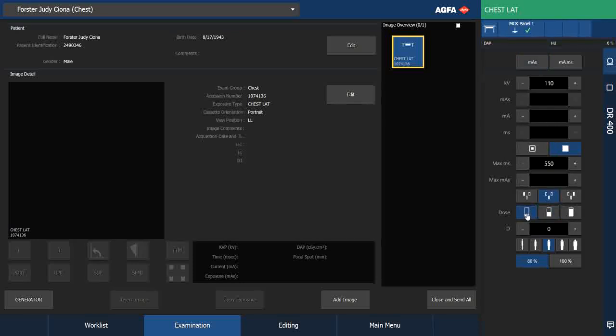So what this does is, if you're used to film, you recall that you had fast screen and film pairs and slower film screen pairs. So this software accommodates functions that are like that, and that can be useful if you're using some of the non-digital imaging applications.